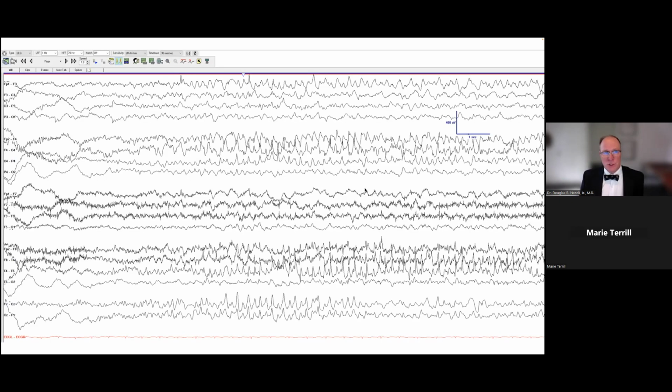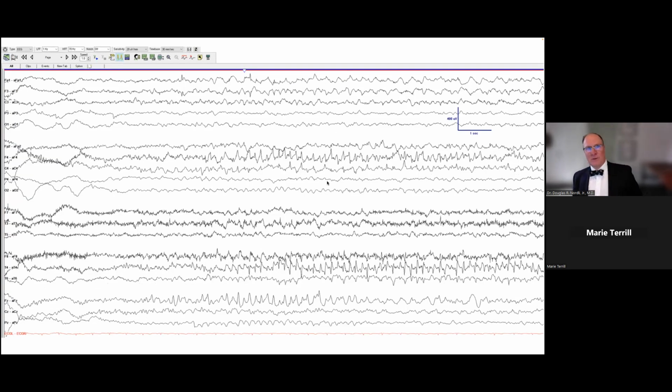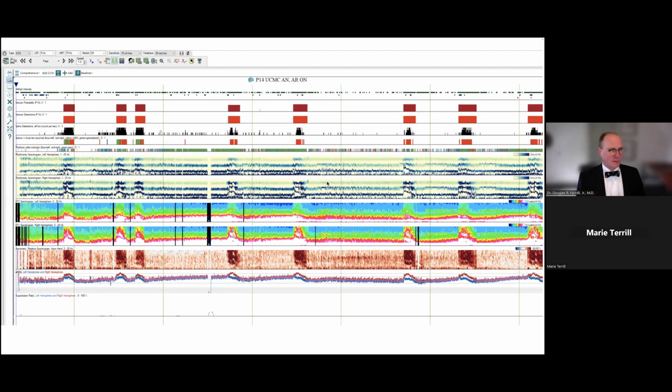And you look at this EEG, I captured it here kind of in medias res, in the middle of the action. You can see that there's low voltage fast activity over here, and typical of an ictal discharge, it's changing in its topography, it's increasing in its spatial distribution as it slows in frequency and increases in amplitude. And so classic, right? Focal seizure is here. Here on the next slide, you'll see, to no surprise, it's not hard to detect.